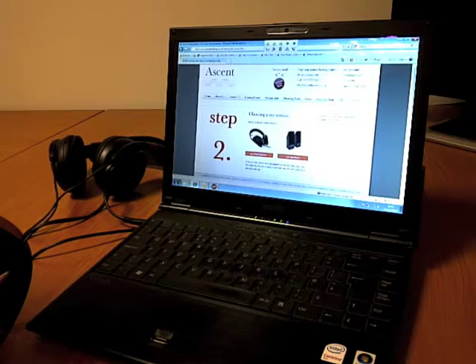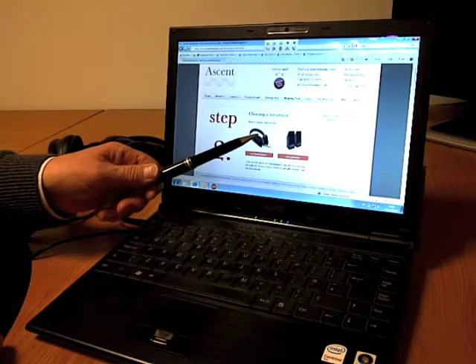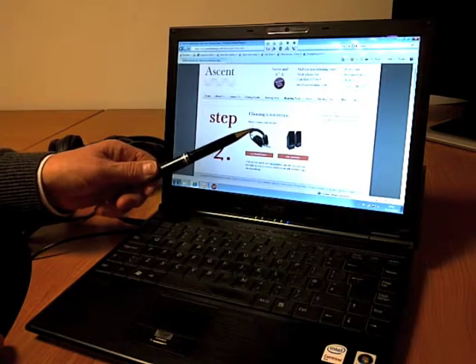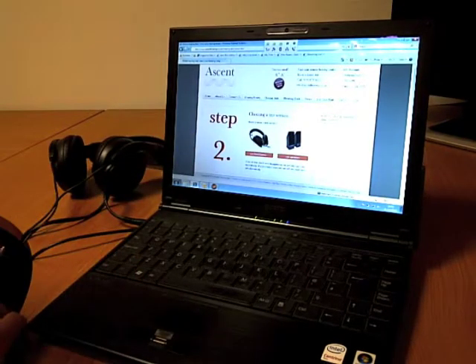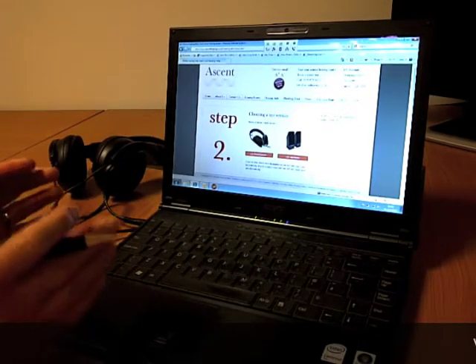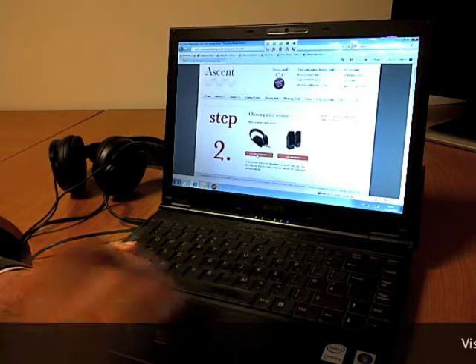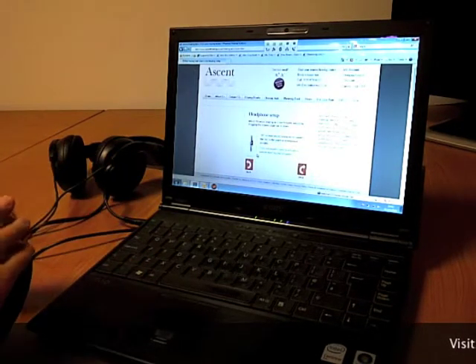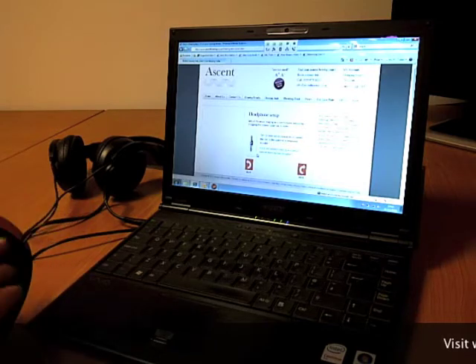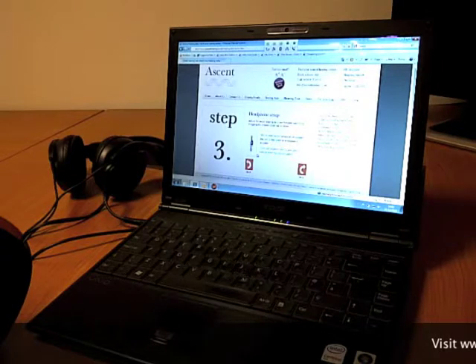And as I told you earlier, the decision now is, do we use headphones, and I would strongly recommend using headphones, or speakers. Because if you're using speakers, you'll only be able to check the hearing of your better ear, because you can't isolate your two ears. So I'm going to select headphones, and all I have to do is click use headphones. And now I need to set up the headphones. This is just a very simple calibration process so that the computer is giving the right output into the headphones to validate the test.